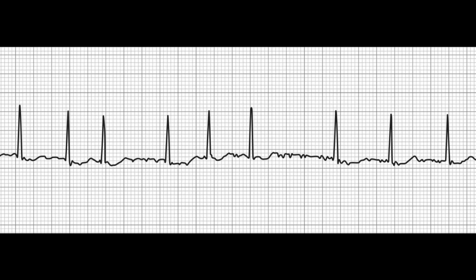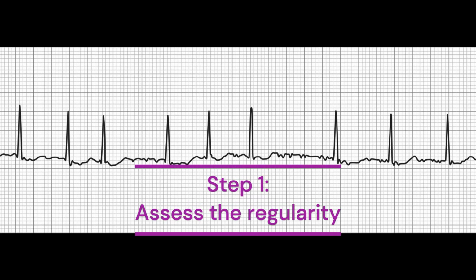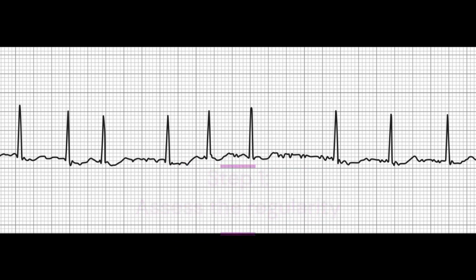We shall be using the 6-step method to do a basic analysis of an EKG strip showing atrial fibrillation. The following steps can be used to analyze atrial fibrillation. Step 1. Examine the EKG strip for an irregular rhythm. Atrial fibrillation is characterized by an irregular rhythm, which means that there is no discernible pattern to the heartbeats.